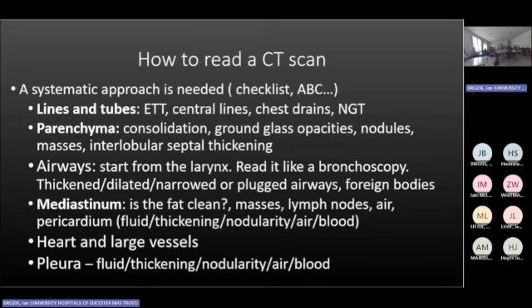The standard scans we do for your patients are not ECG gated, and you have other ways how to look at the heart, but still, the heart is there. It's a static image, so we don't know much of the function, but you can see if the cardiac chambers are dilated or small. You can assess the position of the interventricular septum and so on, and presence of clots, for example. However, before you start calling something a clot, make sure this is not just an artifact.